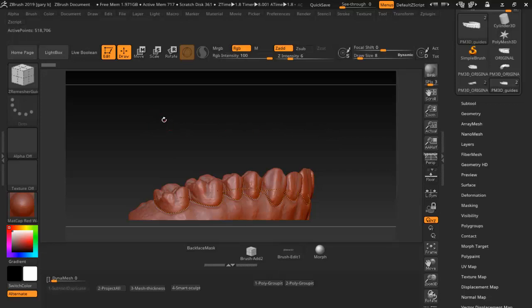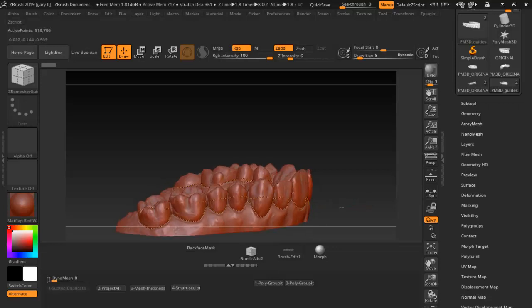When it gets heated up, it'll start sagging like a little bubble at the bottom, and it's got this handle that lets you know when it starts sagging to pull this handle down. When you pull it down, the plastic goes over the teeth, and it's also sucking it to the teeth at the bottom, so it's drawing the plastic down. When it completely dries, then you will remove this impression. Then you can hand cut this out. You can use this for like a mouth guard or whatever you want.